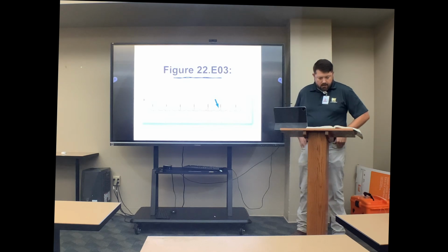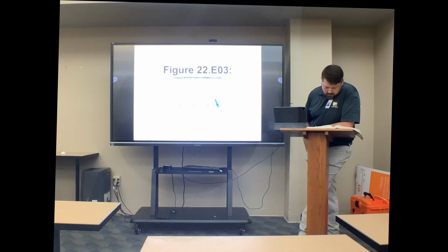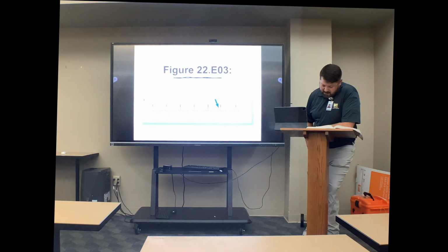What's happening here? This one's really kind of weird. It says right here, the cadence of the ventricular complexes is broken up by a premature complex that is narrow and similar in morphology to the rest of the complexes. This is obviously a PJC because if I were taking my calipers to see if it's regular, this does occur prematurely. The cadence of atrial complexes, however, is not broken and persists through the PJC.